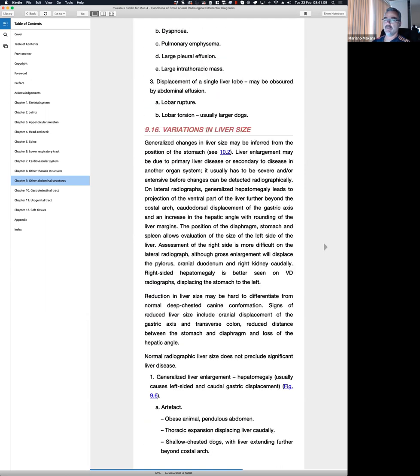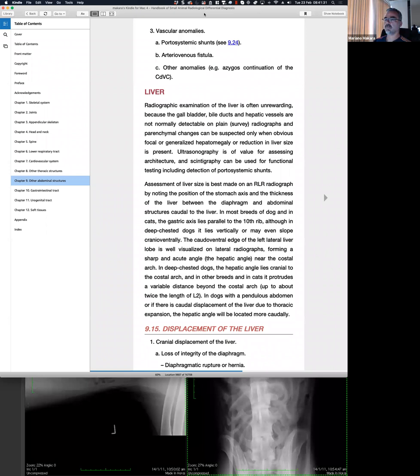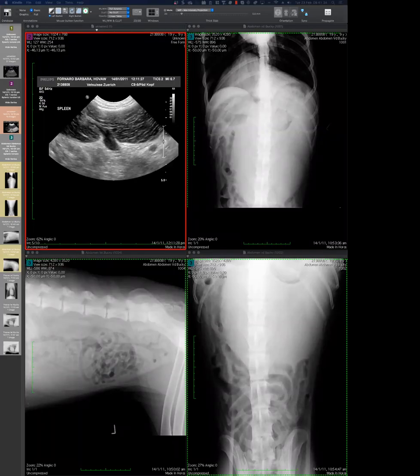And I think Thrall has also very nice drawings, and basically all the organs that are going to be in that drawing are the ones that you can always see, which are gas filled: colon, stomach, small bowel. And hence, those are the key players in every displacement. And it always works. It works beautifully.